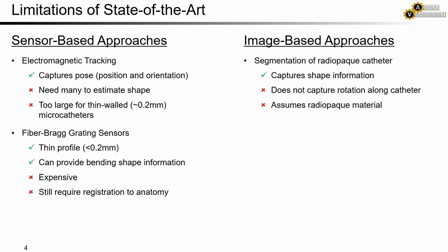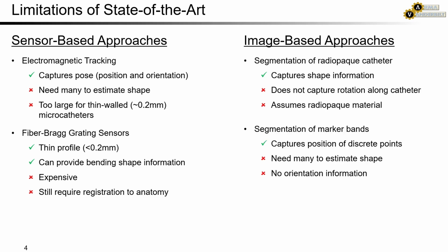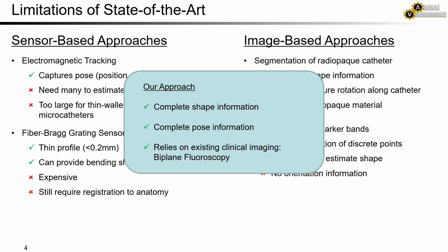rotation along the backbone. As previously mentioned, segmentation of marker bands captures position information at discrete locations, but does not inform shape or orientation. Our approach builds off of existing works by using existing clinical imaging to capture complete shape and pose information without relying on additional sensing modalities.